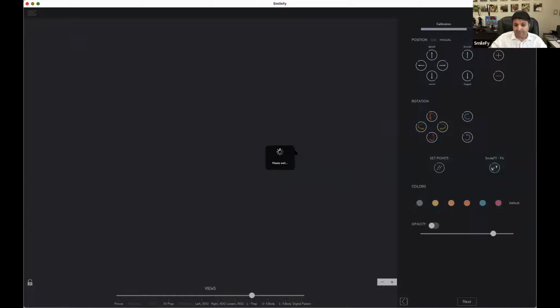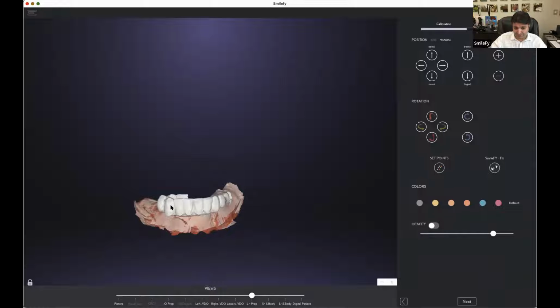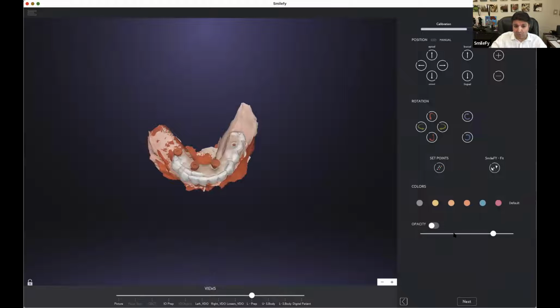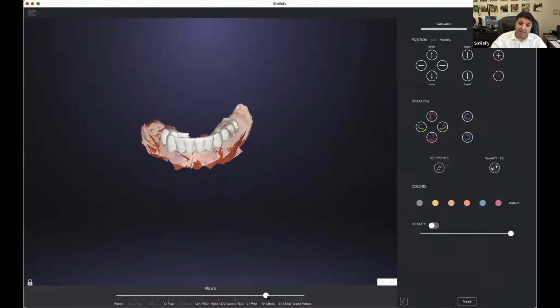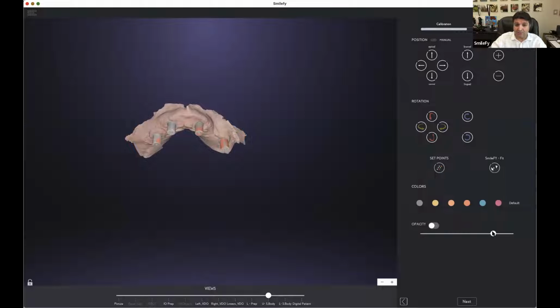Then we do have the new files. So we need to calibrate now the lower jaw with the scan of the implant bridge with the implant bodies, and then we calibrate, you see, the implant bodies from the Peak Dental or iCam with the upper and lower jaw.